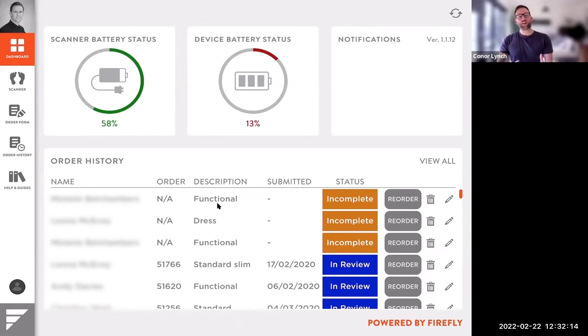And when you call on the template in the future, you can make changes and tweak the prescription as per your particular patient's needs. So the idea of the Fusion saved favorites is to allow you to write prescriptions more efficiently, save you time so you can spend more time treating your patients. So let's jump in and see how it works.